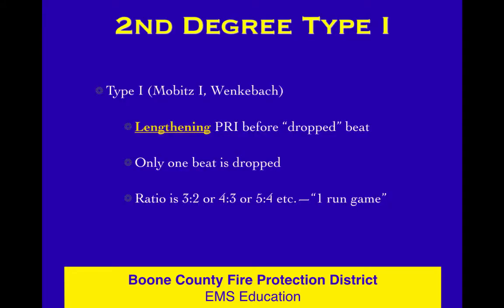Second degree, there's several types of second degree. There's type 1, there's type 2, there's 2 to 1, and there's high grade. So this is the first of those, a second degree type 1. And we can't seem to name things just one thing in medicine. We have to name it 2 or 3 things. And that happens in the pharmacology world as well. And here it is for sure.